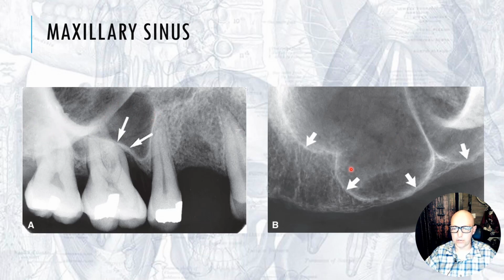This one may be kind of tough to recognize even what you're looking at because we don't have teeth, but it looks to me, because I see this structure and I know what it is, and I know that it extends posteriorly in that direction, so toward my right. I'm looking at the patient's left side, and this is their anterior toward the left, and their posterior toward the right here. And so this is the maxillary sinus. Fairly large. As I said, it continues to pneumatize over time as patients age.